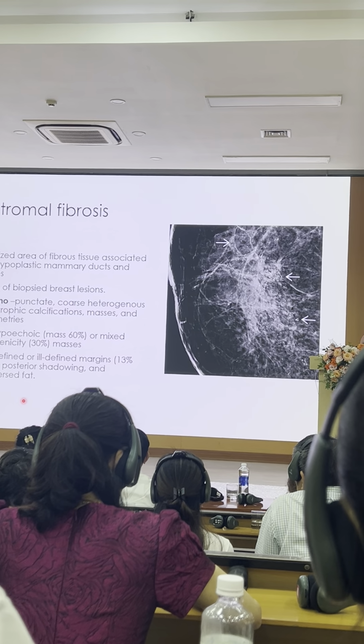So this case here is a 54-year-old woman who was recalled from screening. This is a CC magnification showing punctate and coarse heterogeneous calcifications in a regional distribution. That was biopsy-proven stromal fibrosis, and it was new from her mammogram 2 years ago.